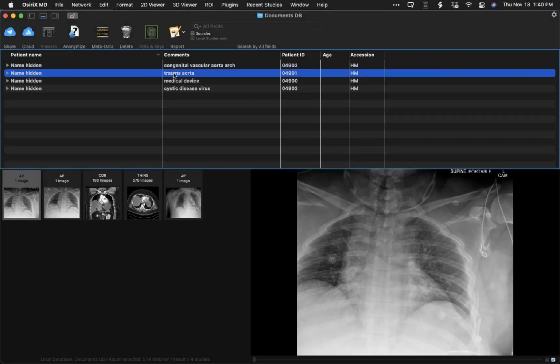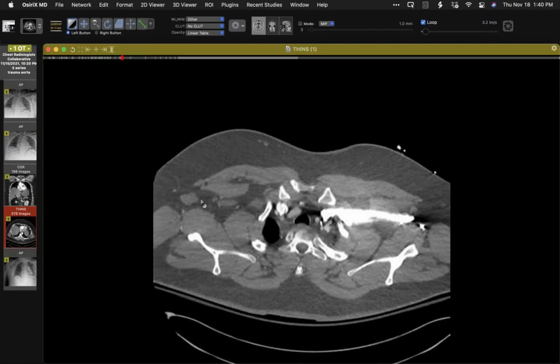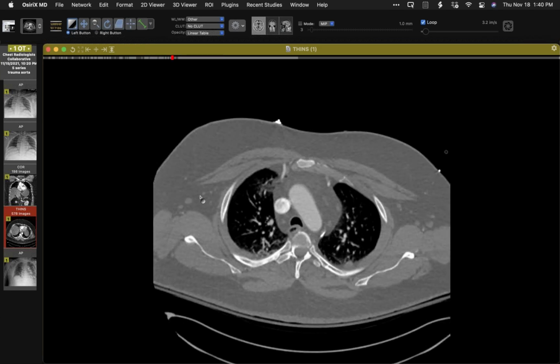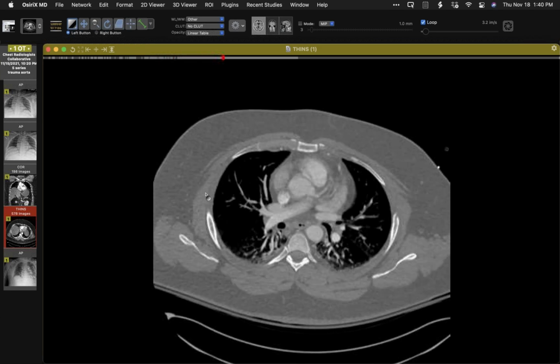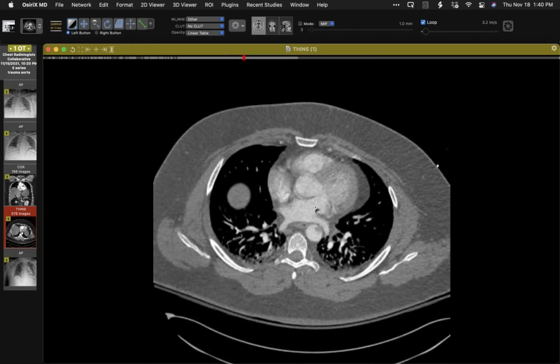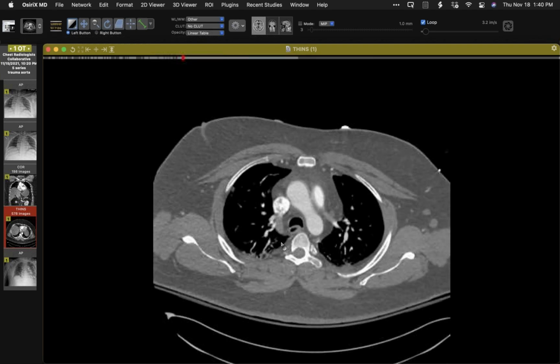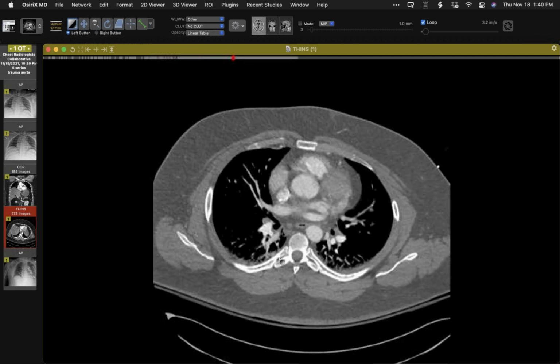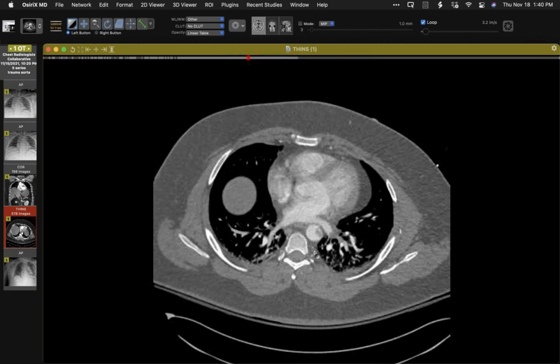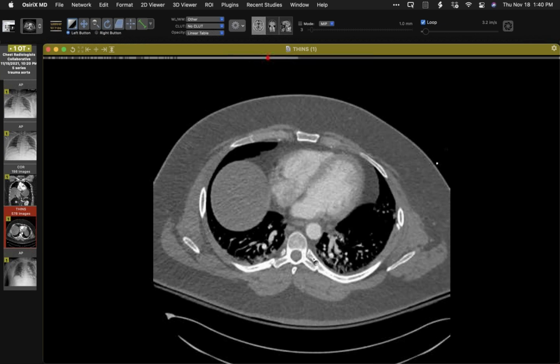Here's a case, and if I'm correct, I think we've shown examples of this a few times at the webinar. Motor vehicle crash, high speed, two vehicles heading into each other. Here we can see in the distal descending aorta, in a couple places, those items.